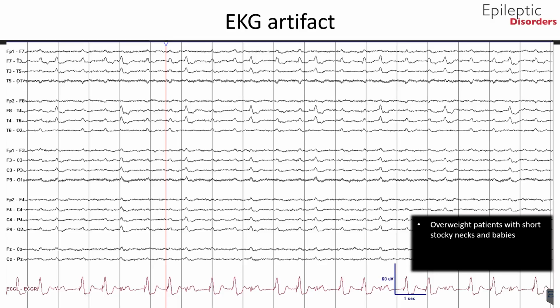EKG interference may be noted as a small spike that, in isolation, may mimic an interictal spike, or in succession and on low amplitude recording, may mimic lateralized periodic discharges or generalized periodic discharges. EKG can be readily identified as a source because of the regularity and time-locked waves synchronous with the EKG. This bipolar montage above shows a patient with a complex cardiovascular condition and an abnormal heart rhythm. Note the synchronization of each EKG spike that is time-locked with the EEG spike outlined in red.